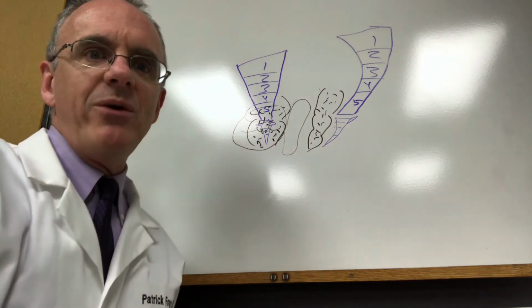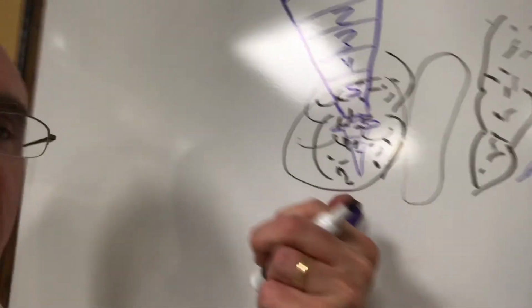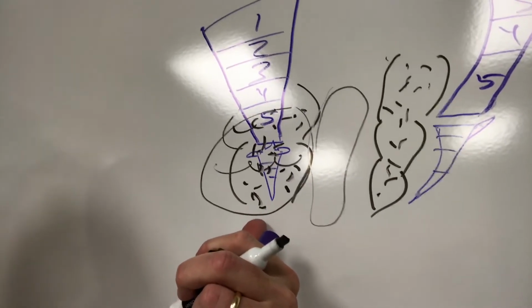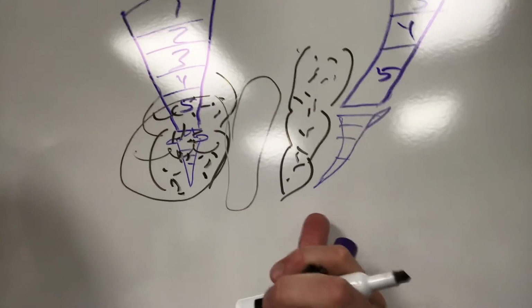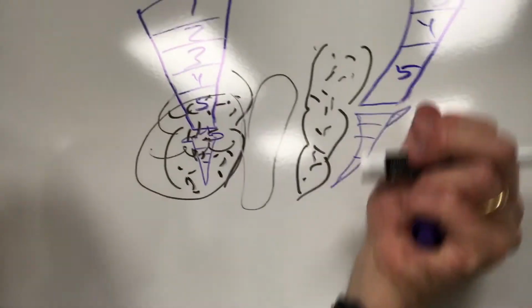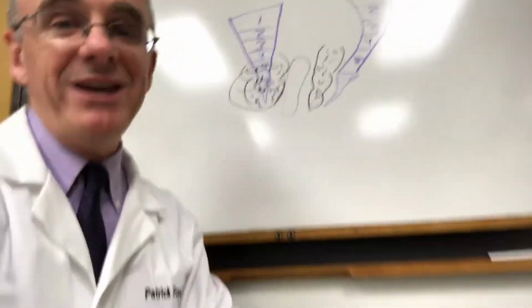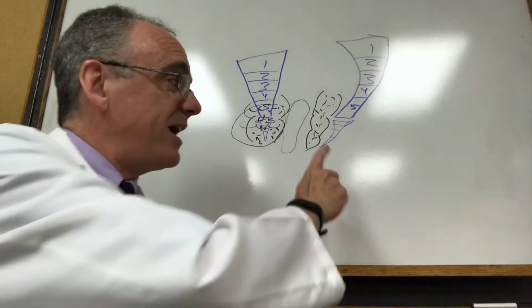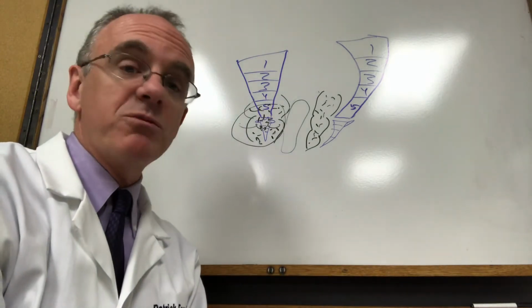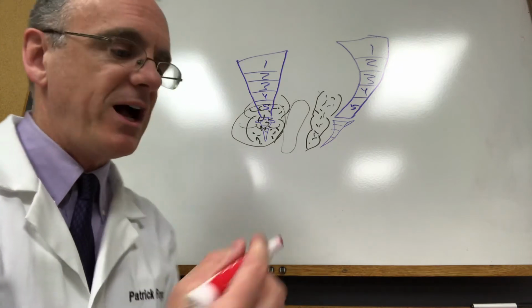And you can see now, unlike the view here from the front, where it's blocking the view of the tailbone, here at the view from the side, this is not blocking the view of the tailbone. The tailbone is still nice and clear. So I would say probably 99 times out of 100, maybe more, the side view is going to be much more helpful and much more important when it comes to showing the coccyx.